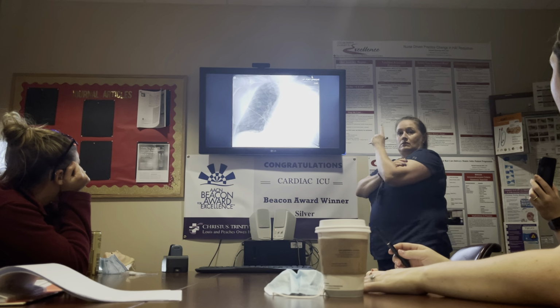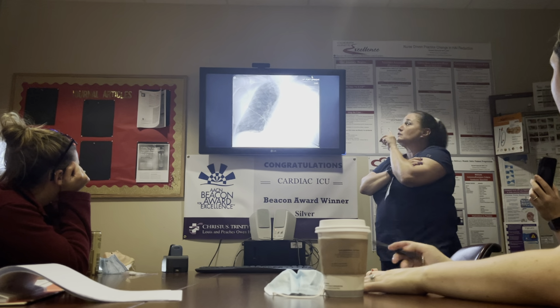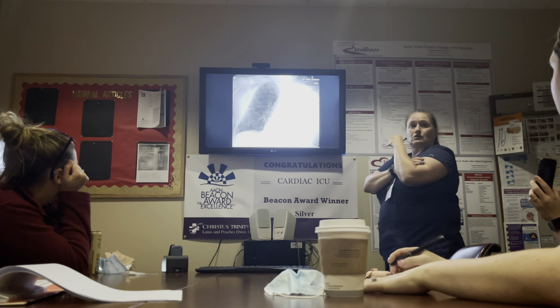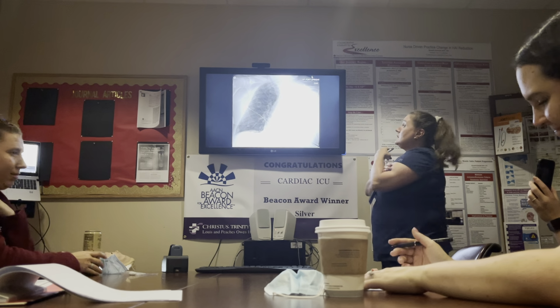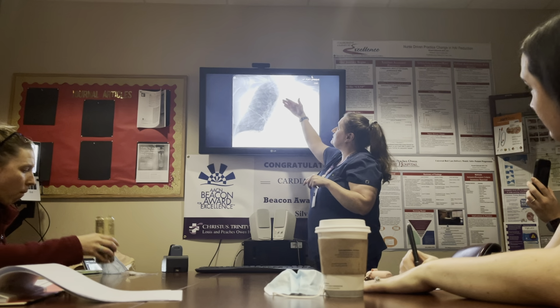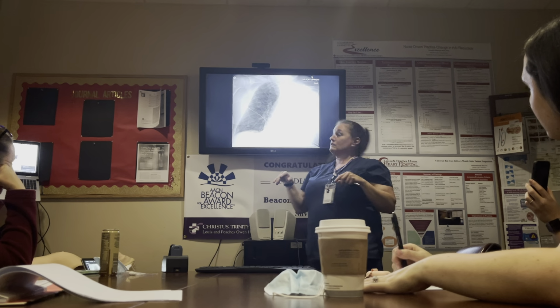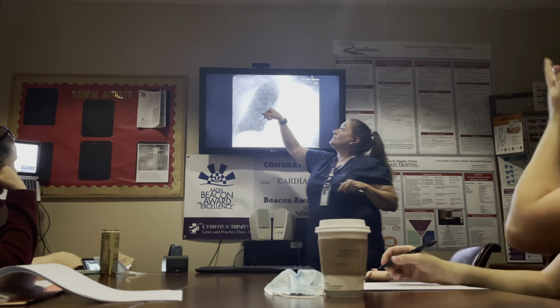So this one, two things, probably mucus plugging, may have a pleural effusion as well. So this would be somebody that I'd want to bronch. I'd want to square up their tracheostomy tube, but I'd also like to know if they're full of mucus, and this was where I would go suck snot, okay, to see if I could open up that airway. Because again, you see the shift, you really don't see this budding off, so there's something going on in there. And more than likely, it's going to be that they've got a mucus plug in there, okay? All right, and I don't see a lot of extra stuff. There's a PICC line there too.